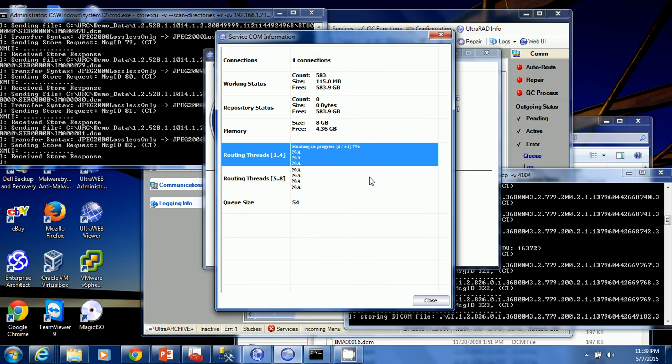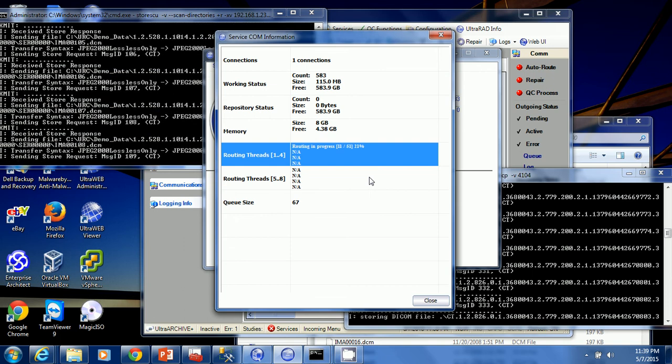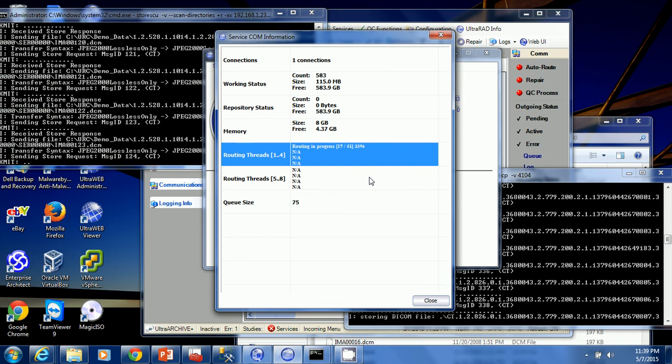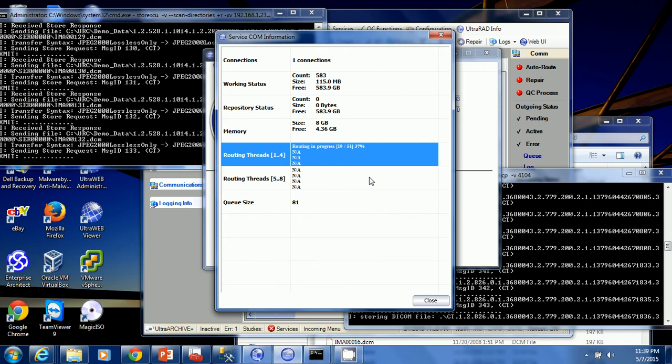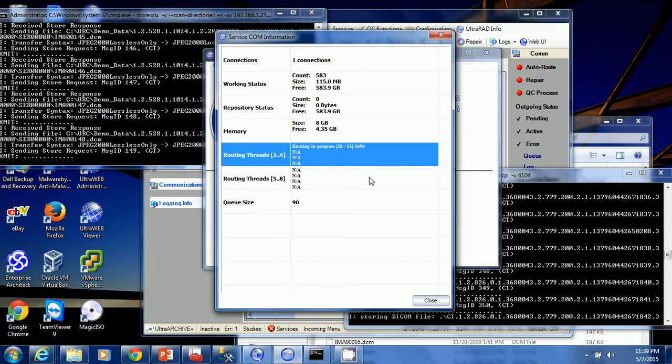So there you can see now it's up to 51. So it's going to continue routing. We can see that traffic routing in real time from the left side to the right side. So if these were CT images, and there were thousands of images in these CTs, there would be very low latency in the routing going through this routing product.